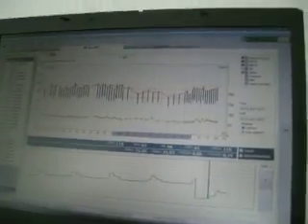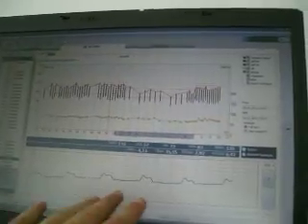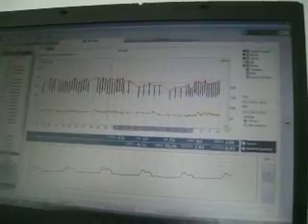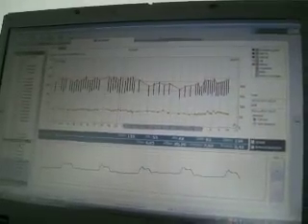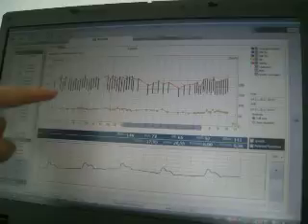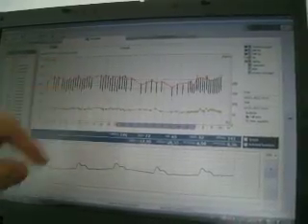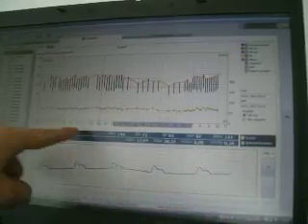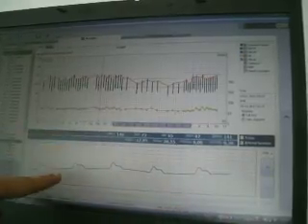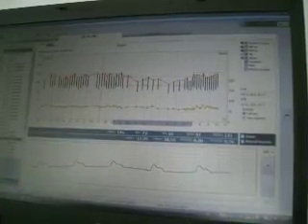Now, if you would like to go more into the details of one particular arterial function evaluation, just click anywhere on this list. It will show you on the graph which particular measurement is chosen, and here in a separate window you can see the suprasystolic waveforms from which the arterial functions are calculated.